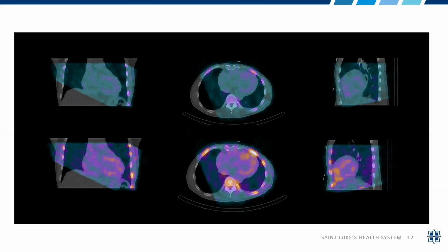But if you're going to convert that over and say, I want to grade this as a grade 0, 1, 2, or 3 on the SPECT image, this would be a grade 1 where there's probably some myocardial uptake there, but it is certainly below the rib uptake. But we don't see this very often. And so to me, this was someone who needed further investigation.